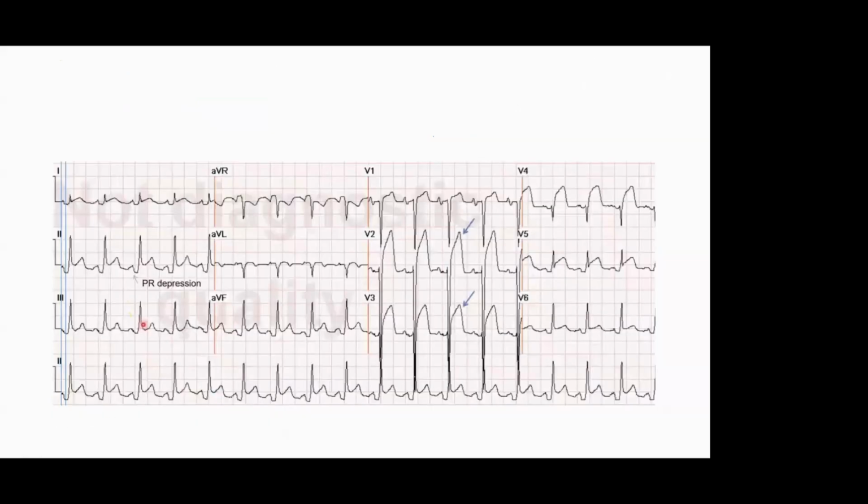This ECG, can anyone tell the diagnosis? Please apply the 5 points I told. You just tell that and find out what the problem is. Can anyone volunteer? Try to apply it.